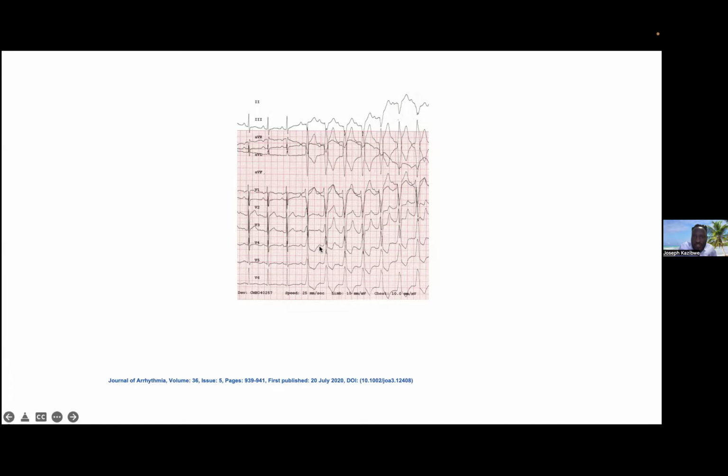And what is happening, from the sinus node you're going to have conduction via the accessory pathway, which is a broad complex because it's not using the specialized conduction system. In that way, you can know that this patient has an accessory pathway. So this is an adenosine test. That's how it would look on the ECG for somebody with an accessory pathway that conducts downwards.